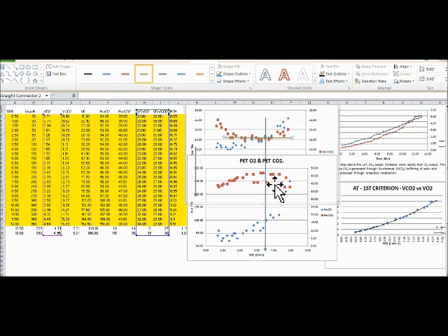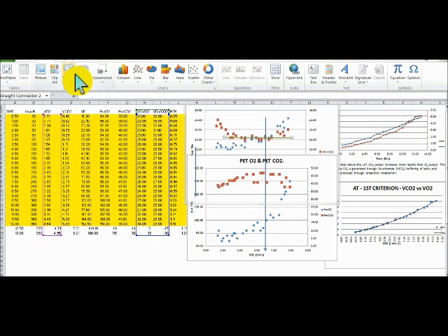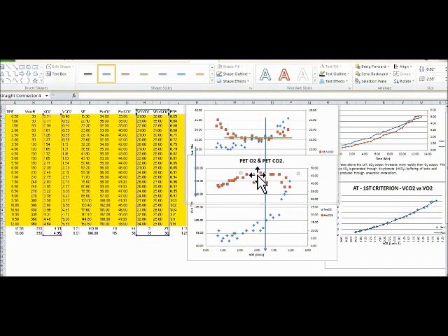And then also we're looking at where PET-CO2 levels off as well. So let's get another line. Let's see, PET-CO2 looks like it levels off right about here, with the exception of these kind of skewed values here. So let's see, that's pretty good right there. Pretty nice straight values. And let's make that one this color.